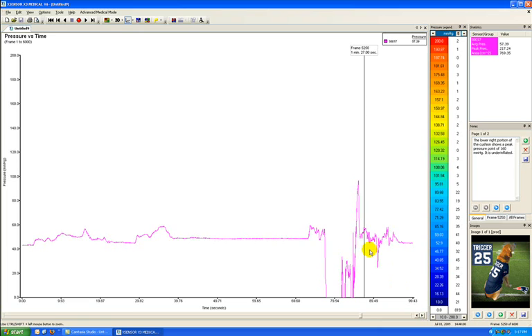So I'm able to see the pressure at any point in the recording, along with the pressure data in the legend to the right here. This is a good indicator if you've had a particular shift or increase in pressure, or in contrast a decrease in pressure that you're interested in. So if a patient shifted in a certain way that caused pressure to spike, you could see exactly what that pressure was, and at what point in the actual recording that occurred.